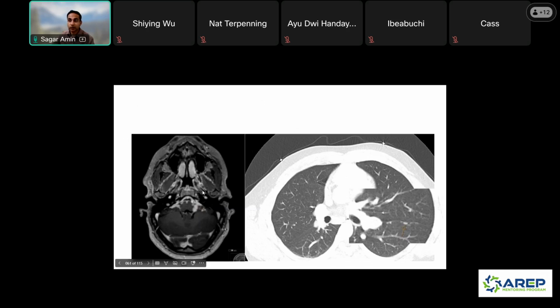So we have brain findings of a leptomeningeal enhancement, and then we have lymphadenopathy with some nodules along the fissure. So what do people think? Do they feel that this has narrowed their differential to a specific diagnosis? Yes, it does. Sarcoidosis. Sarcoidosis, great. Yeah, exactly.